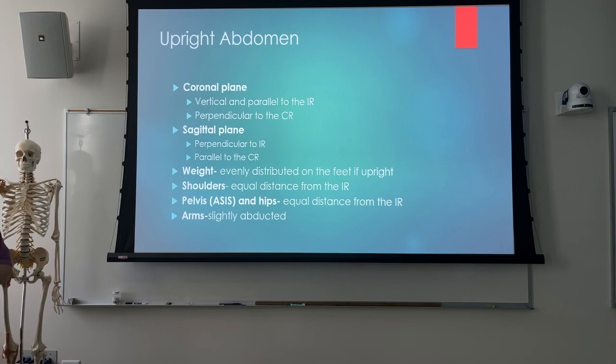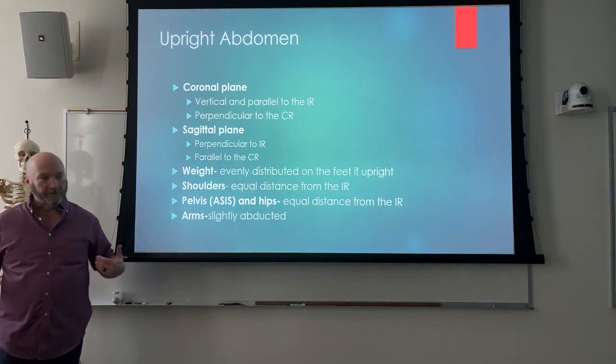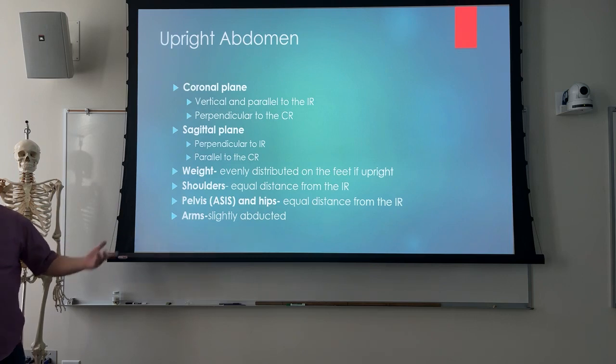The reason for that is, what do we normally shoot upright abdomen for? Two things: air fluid levels and free air, right? So where's the free air going to situate? Under the diaphragms, right? Because your abdomen's all water, so the air is going to go up and everything else is going to go down. Chances are, if you're doing an upright abdomen, you probably did at least a one-view chest x-ray on the patient as well, and you can see where the free air is.